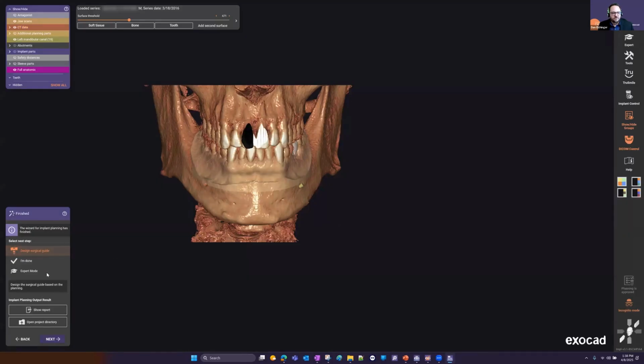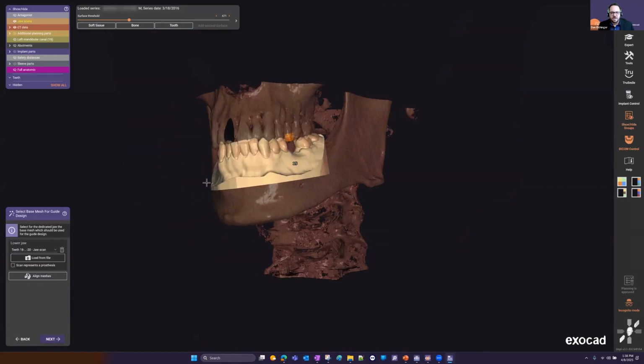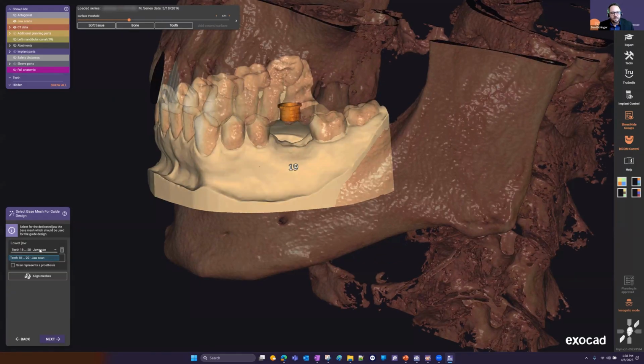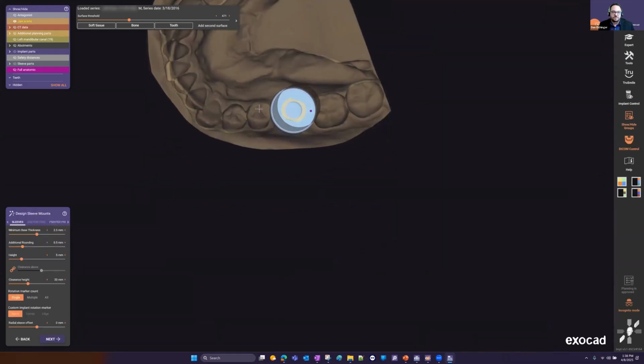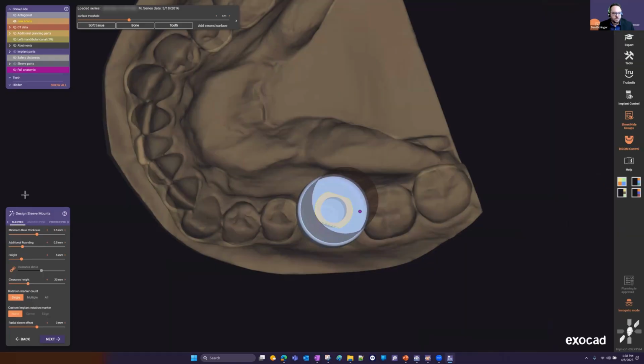So now we will have the ability to design our surgical guide. So from here with our new workflow, you can actually load in separate scans if you receive updated scan data. And I think that's probably more utilized with the dual scan protocol. Maybe you receive an optical scan of the patient's arch, or you want to use the one generated from the DICOM of the patient's prosthesis.